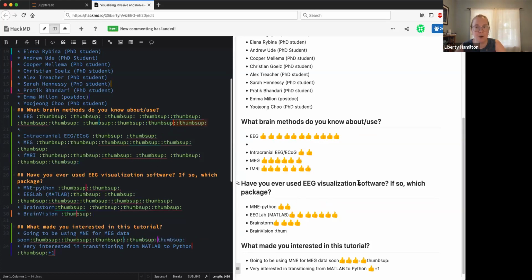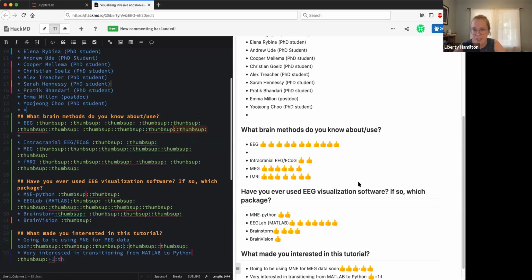So you can go all the way from your raw EEG data or intracranial EEG data all the way to artifact rejection, independent component analysis, filtering, plotting, analysis, all of that, all in one thing.